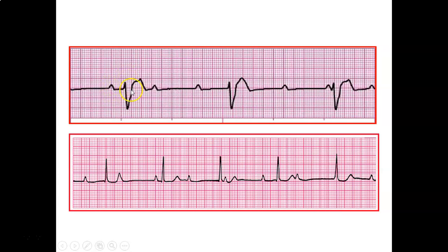This P followed by the QRS complex. This P, no, this P very long distance. So it looks like the PR intervals are variable and complexes are wide. So this looks like the atria and ventricles are beating independently. So this is third degree AV block.